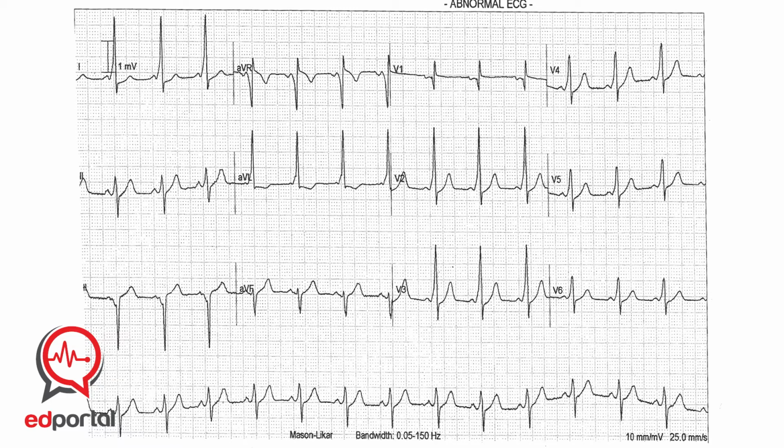So we treated our patient as AF with WPW. We thought the safest option would be to DC cardiovert the patient. So he had 200 joules of DC cardioversion under procedural sedation, and this is his post shock ECG. Now we can clearly see that there's a short PR interval, delta wave, and a wide QRS. So he's in sinus rhythm now with WPW syndrome.